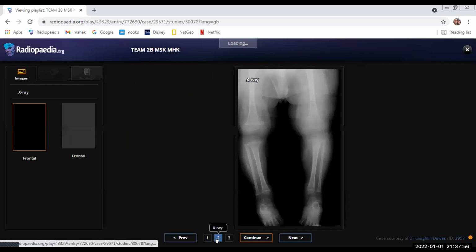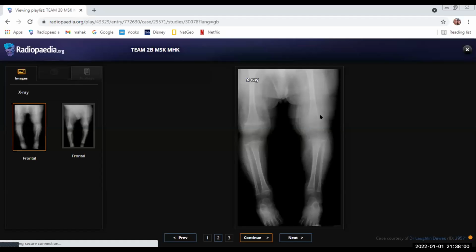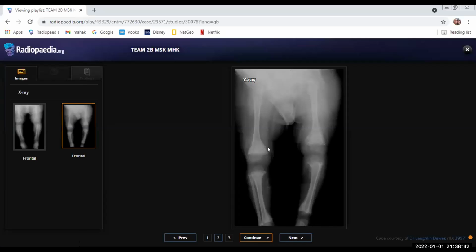And this case, yeah, this was scurvy actually, because there was no bowing, and the epiphysis is thin, it shows a typical Wimberger sign, and the dense metaphysis. In rickets we find metaphyseal flaring, and it is sort of lucent. And there is a dense metaphyseal band here, what we call the Trümmerfeld zone and the white line of Frankel. So this was the white line of Frankel, and just adjacent to it there is the Trümmerfeld zone. It's not very well seen here, but obviously the white line of Frankel and Wimberger sign plus the subperiosteal elevation you can see very well.